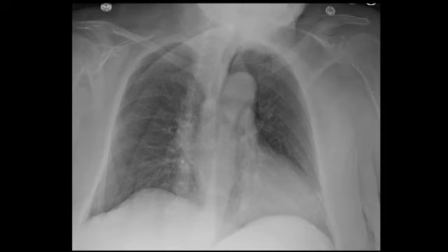This chest radiograph demonstrates a mimicker of pneumothorax. This patient has multiple skin folds projecting over the right hemithorax. You can see that these extend beyond the contours of the right lung, therefore do not represent pneumothoraces, and you can also see that the lung markings extend beyond the linear lucencies projecting over the right hemithorax. So these are skin folds, not pneumothorax.